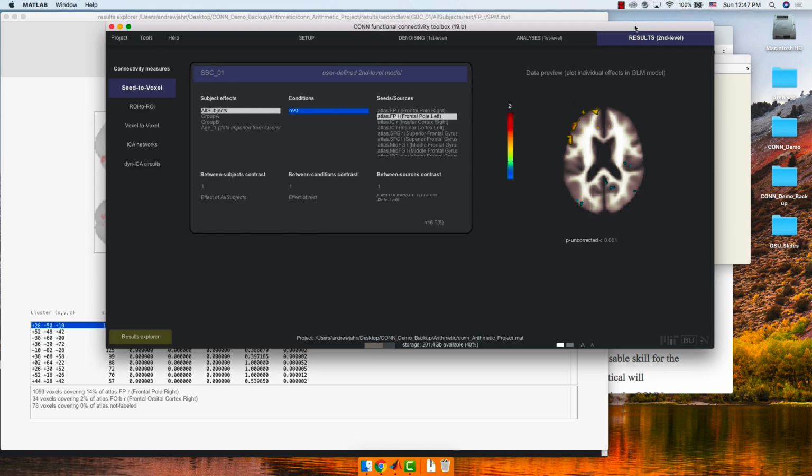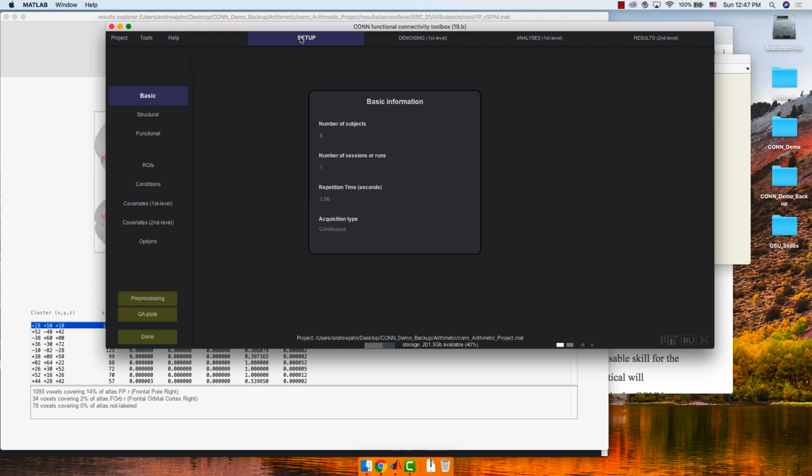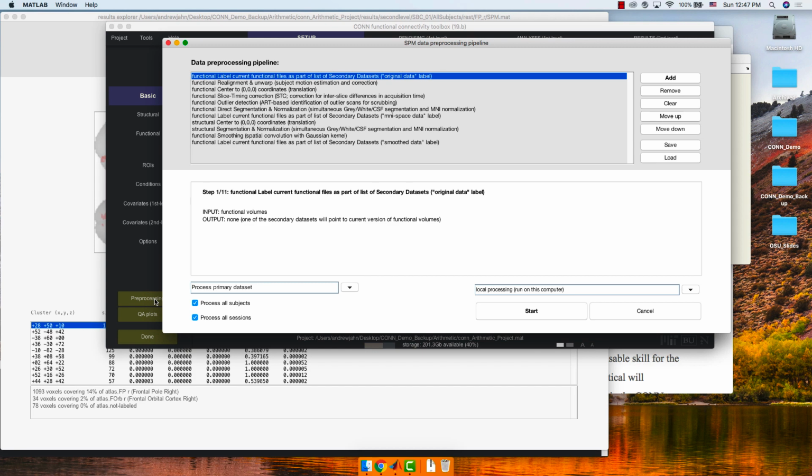Again, you don't need to follow along with this, so I'm taking a brief detour. If I did want to analyze everything on the surface, I would first have to do everything through FreeSurfer. In that case, I'm not encouraging you to do this, I don't want anything to go wrong.